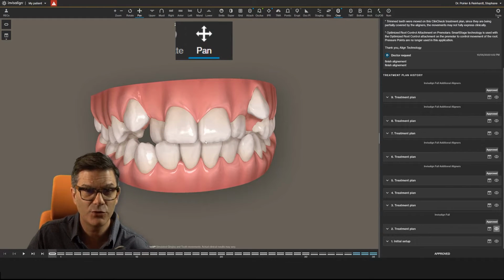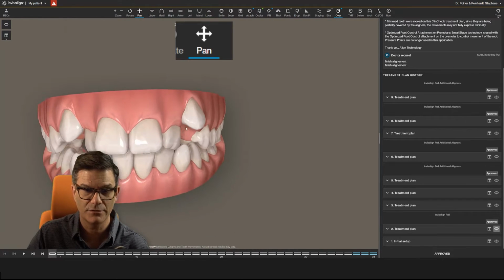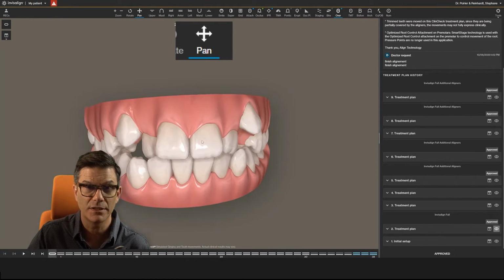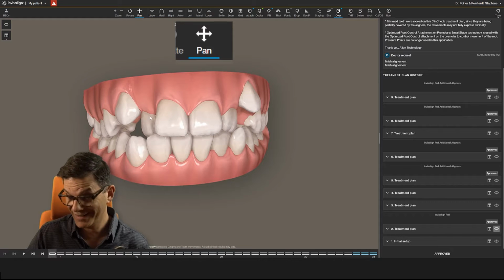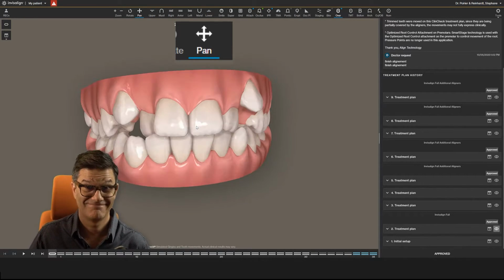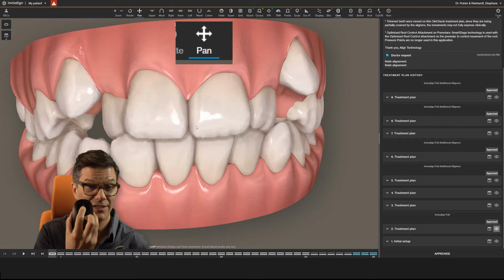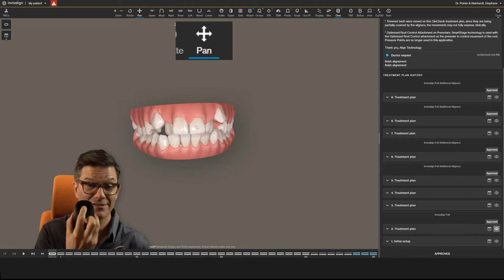And you have the pan tool. So this is going up and down and left and right. But let's say I don't want to click every time. What I can do is use my mouse. I have this little thing here. Look. Et voila. This is what it does.